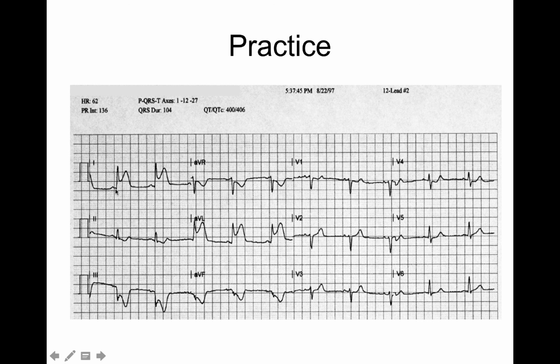So final answer is lateral wall infarction or an injury that's going on with inferior wall ischemia. Okay, lateral infarction, with 2, 3, and AVF, ischemia going on.